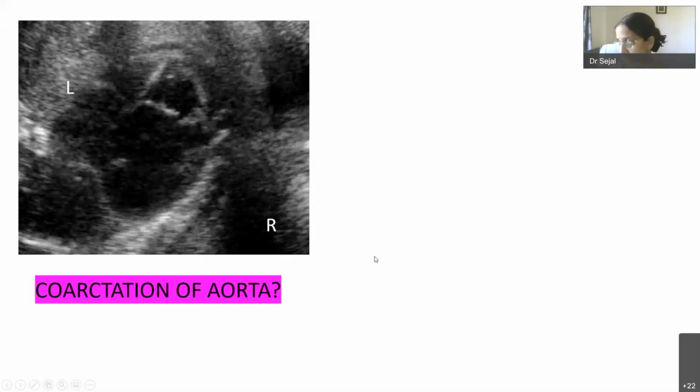This is big. Recently, it has become a very common thing about suspected coarctation. If my RV is also equally dilated in the other views, then the question comes, I have unexplained right heart dilatation. If my RA is only dilated, then one classical possibility is going to be right atrial aneurysm. Just as we saw the LV aneurysm, RA aneurysm is a possibility. How will I differentiate it from a disproportionate cardiac chamber situation where my right heart is much more dilated?